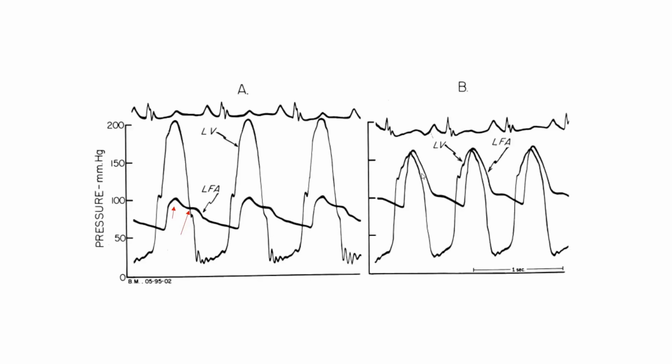We did something to the patient to make the obstruction disappear. In this case, this was after an LV gram. So you gave a big load of contrast in the LV, you increased the preload, and therefore you eliminated the gradient. And the spike and dome vanished. That's the beauty of dynamic LVOT obstruction. It's not about analyzing the gradient. It's about analyzing the LV and aortic morphologies.